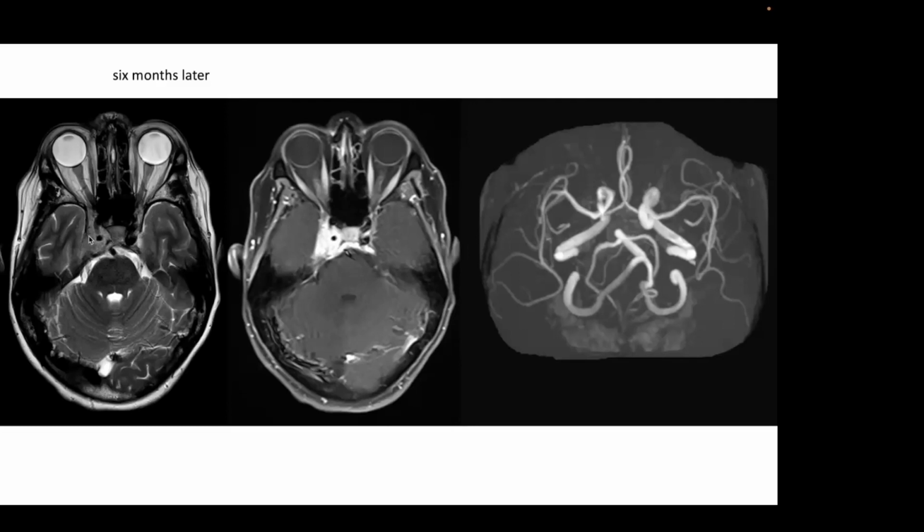So when you see that low signal, maybe inflammation of the cavernous sinus. That's an excellent thought as well. That's Tolosa-Hunt, and that's always in the differential, and oftentimes difficult to distinguish. Now, I will tell you, in most cases of Tolosa-Hunt, you do not get carotid narrowing, but every once in a while you do. So I think that's a reasonable thought.